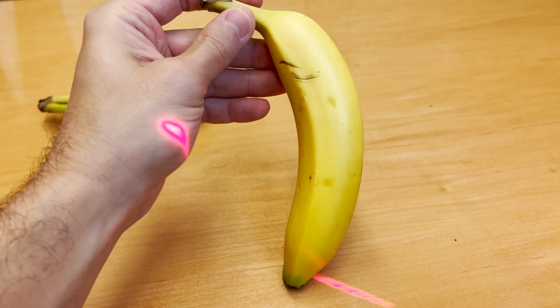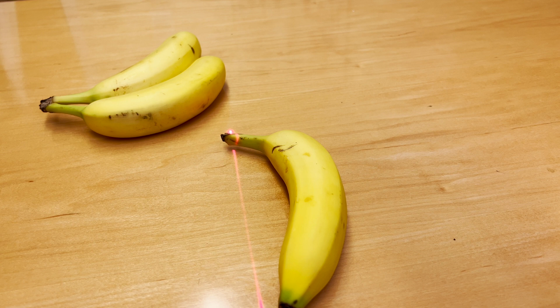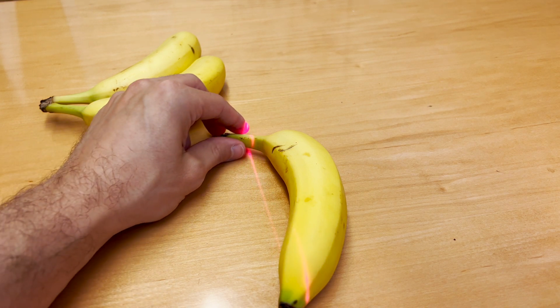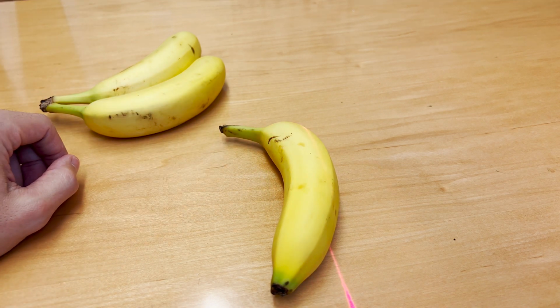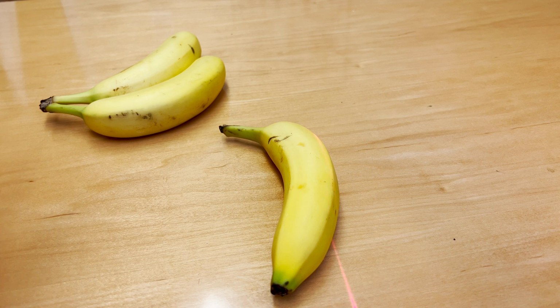And then if we make cuts through the banana more like this, you can see how the cross-section here might be a cut through the stem and then a cut through more of the bottom part of the banana, just like that. And so you can see how in those three different orientations you get three different types of images.